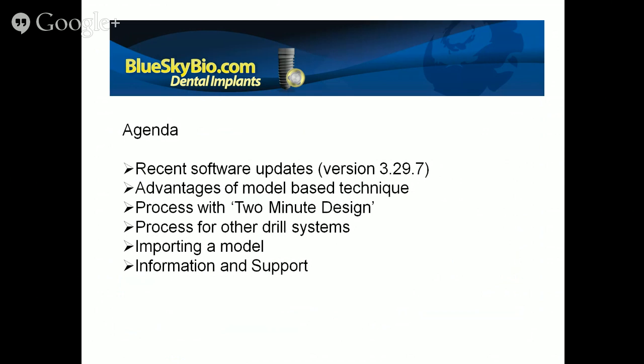We're also going to see the process is slightly different if you're using another drill system. If you're not using the Blue Sky Bio drills, but you're using another drill system, then we'll discuss that process as well. Just as a comment, the software and the surgical guides could be used with all implant systems and all guided surgical kits. So you can make surgical guides for all systems.